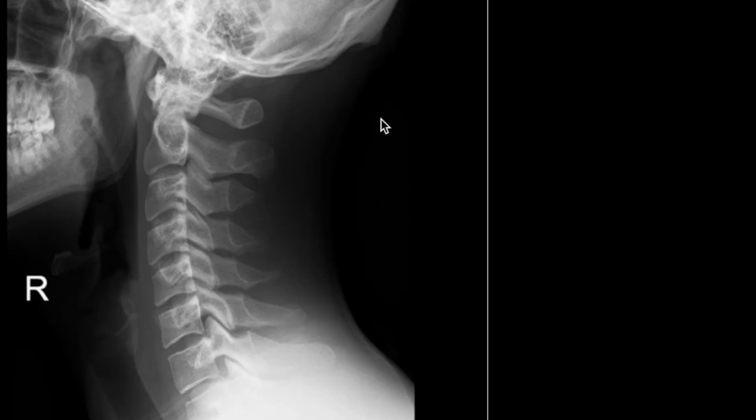When it comes to counting vertebra, the easiest way to do this is to look at lateral views of the spine. You can do this on CT, obviously, but it's really easy to do on a neck x-ray, which is typically what's ordered before any CT imaging, so you're more likely to encounter it in this manner. You can make out the C1 vertebra right below the base of the skull, and you can either count the vertebral bodies below it or the spinous processes here in the posterior part. So here's C1, C2, 3, 4, 5, 6.